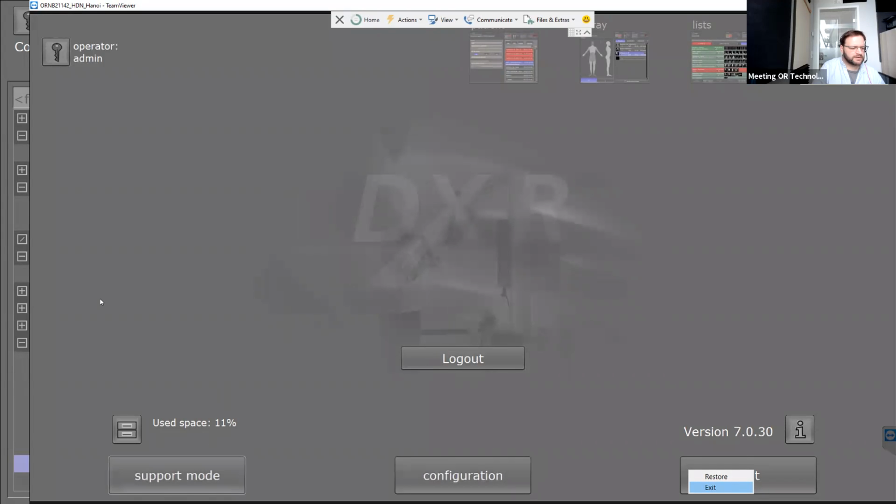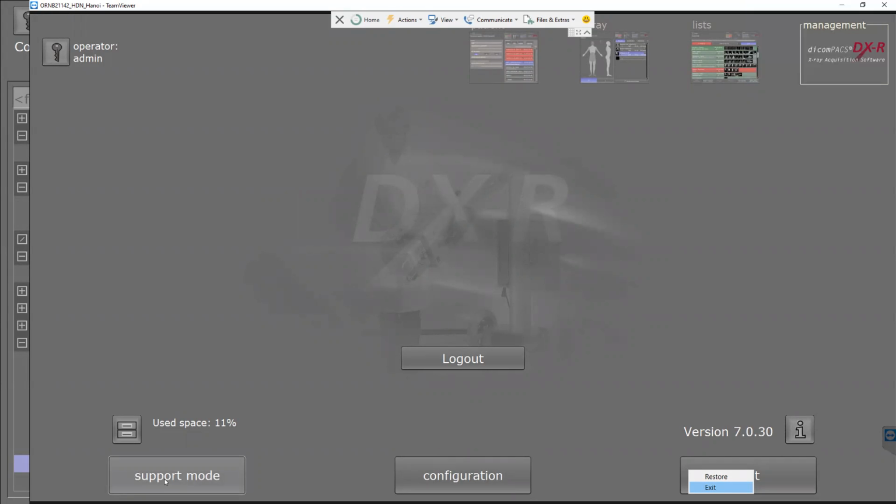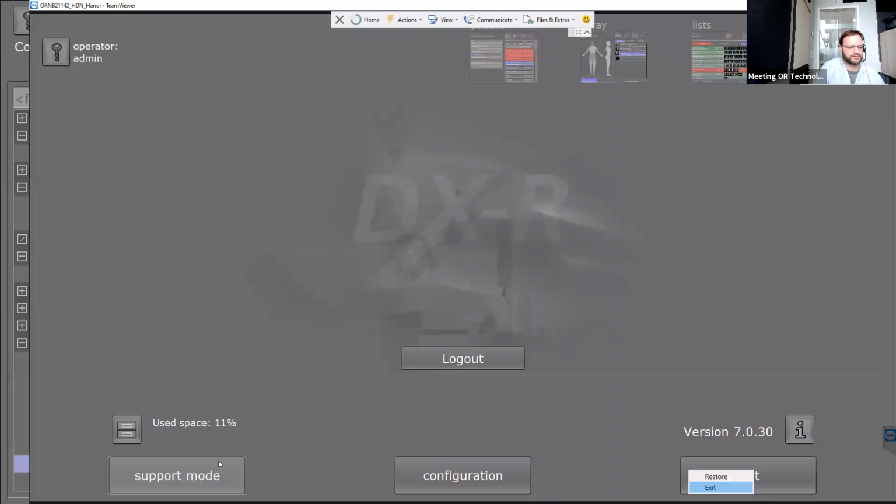Okay, so the license is all in. Next thing is the DICOM print connection. DICOM print connected. Everything is okay. Yes, everything is working, or should I check it?